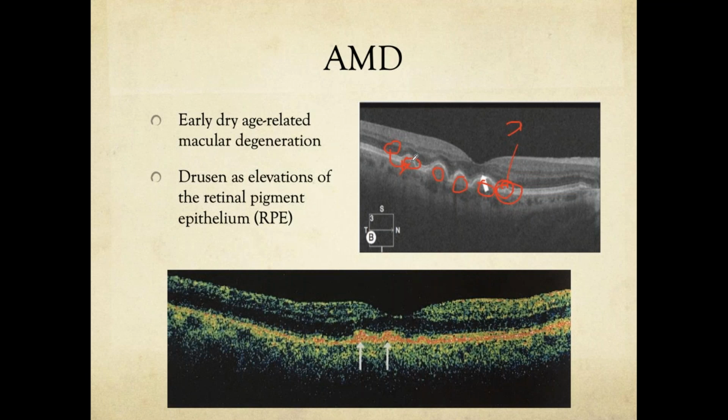It is something that matches the reflectivity of somewhere around here, or somewhere around here. So I would say this is a PED, but it's a drusenoid PED. This is a pigment epithelium detachment, but it's a drusenoid. Also, when it is detached, always look into what is filling up the spaces in the retina, in the pockets where it's created. So here you see some things that are being filled. So this will be a drusenoid PED.